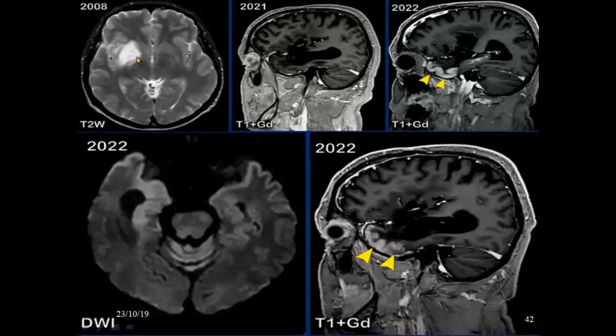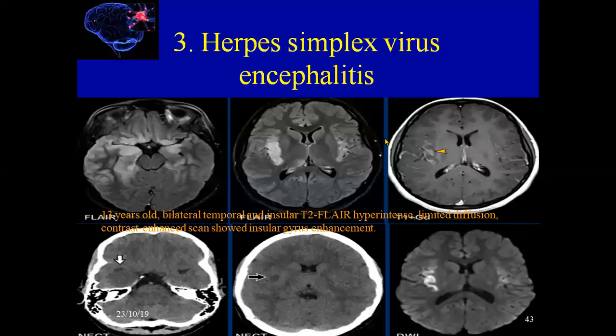Here, a patient with glioma in the brain underwent radiotherapy and surgery. As we see at 2 years post radiotherapy, the gyri start to show enhancement. This is a gyral enhancement here. This is what's called post radiotherapy enhancement. Here we also have herpes simplex virus encephalitis of both temporal lobes in this area. This can also show, on MRI, enhancement of the gyri here.